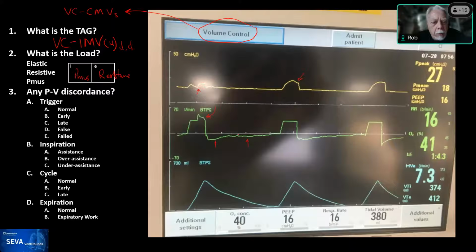Yeah, generally there's some that are small, but there's others that are a little bit bigger, Rob. You see this one, how this one looks here, and this one looks here, and you can see that too. Yeah, they could be superimposed. Yeah, so I think that there may be, I mean, this seems to me that the patient is activating the expiratory muscle. So it's going actively with, I mean, this would be consistent with increased resistance.